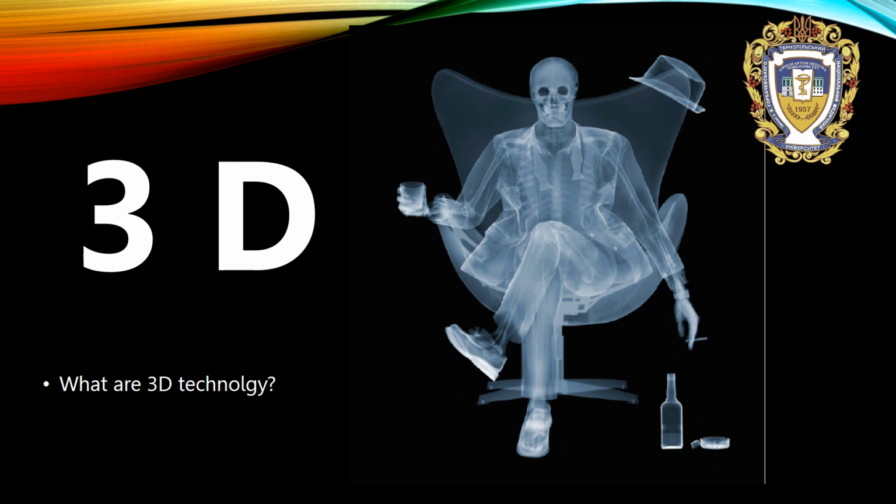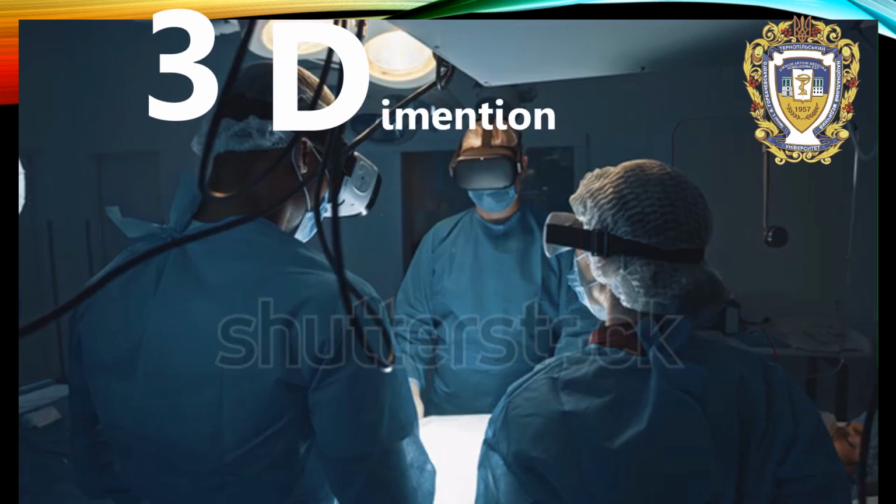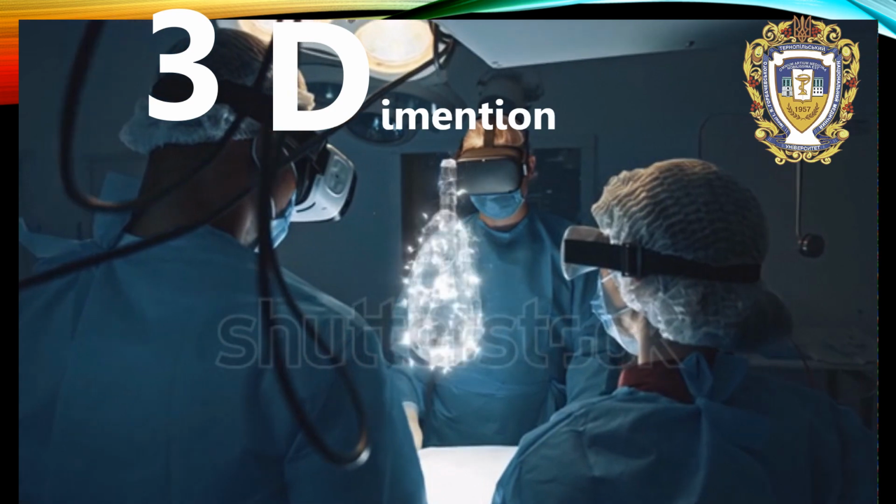And modern X-ray technologies, it is 3D technologies. What are 3D technologies? 3D technology is evaluation of different areas of the human body, different organs, in three dimensions. 3D means three dimension.